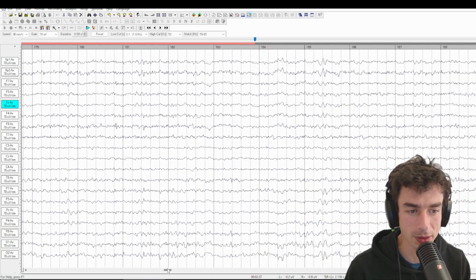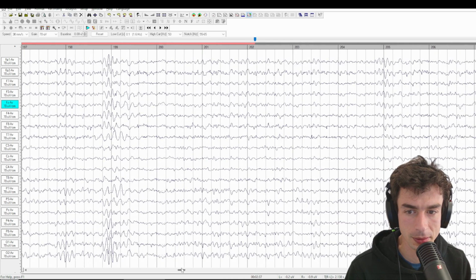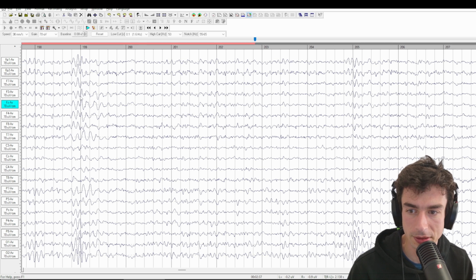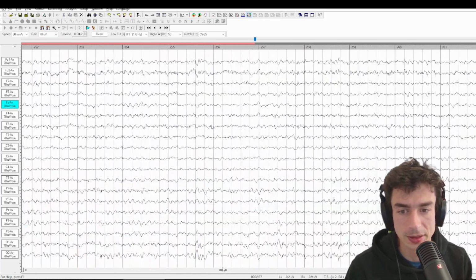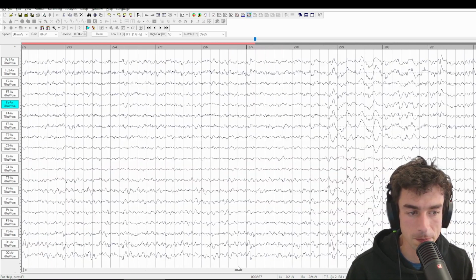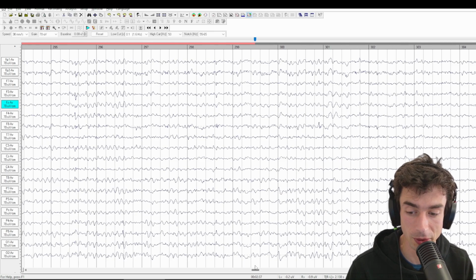We'll catch another one. This one's interesting here because it's alpha followed by slowing of the alpha and then this kind of dropout. Since it's the same pattern that tends to repeat itself, we'll keep scrolling, try to find a juicier one, if you will.